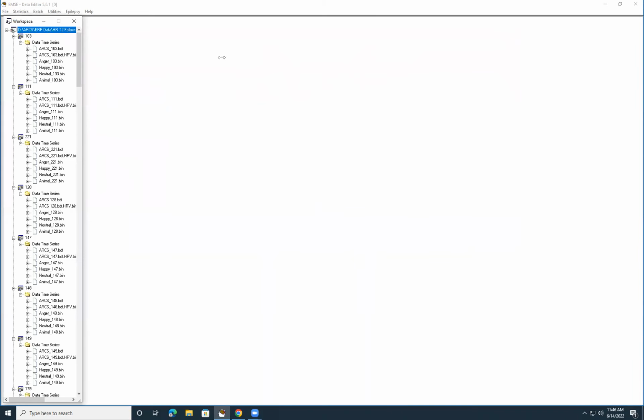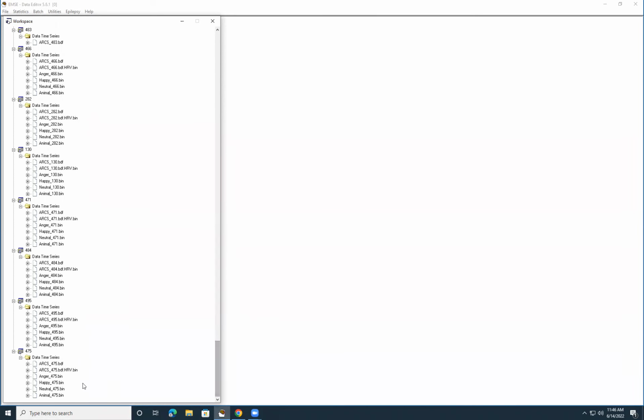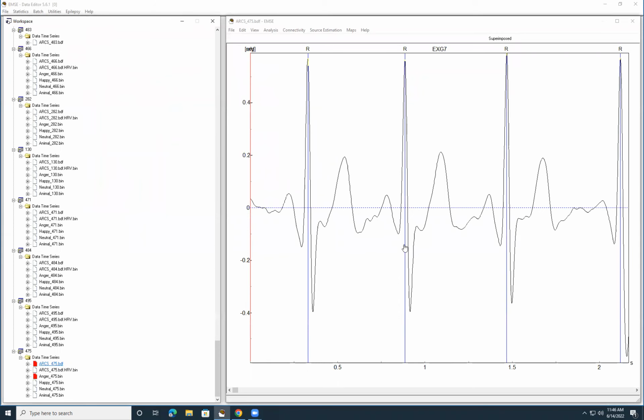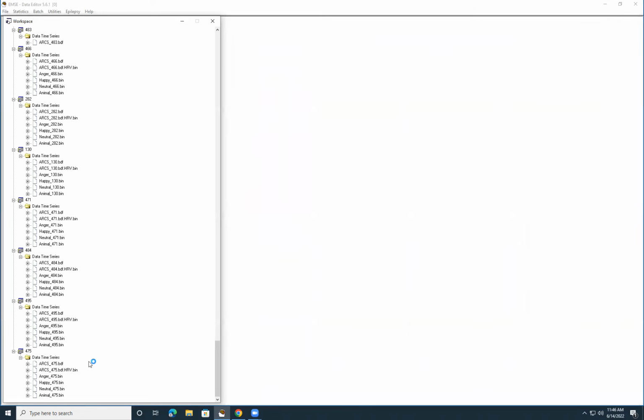Now we'll do the exact same thing. You see how everything is opened? We can click on a recently done example to make sure that we're in the right place. That looks like a finished heart rate. This looks like a processed heart rate file. And this looks like the file that occurs after the scripting. But one of the big giveaways is that heart rate files will always have this hrv.bin file in all of them, which never is going to appear in an EEG ERP workspace.